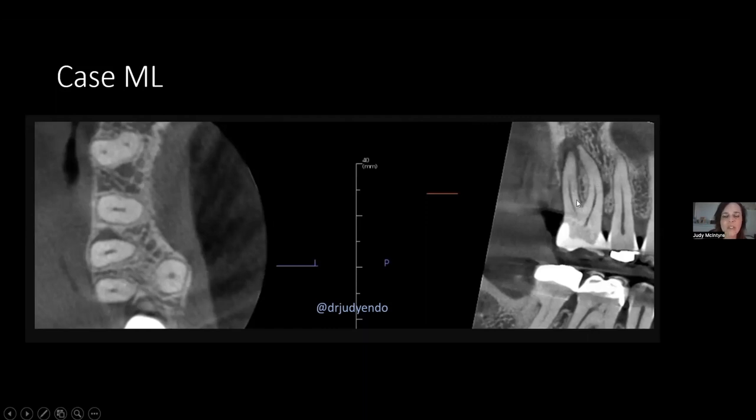So this lady is just filled with lateral accessory canals, right? And when they stay dead for that long, they're going to start to leak their bacteria out into the bone at every portal of exit of the tooth, right? Teeth, I hope we all know now, don't just have one portal of exit. Most of them don't anyways. And again, possibly that small angular defect here that I noted on that 2D from before.